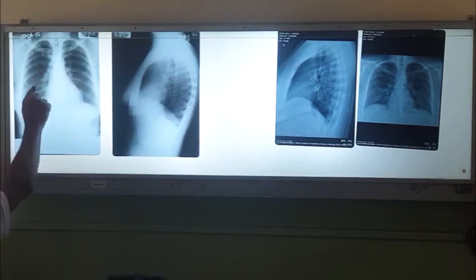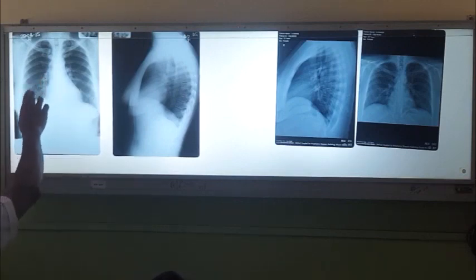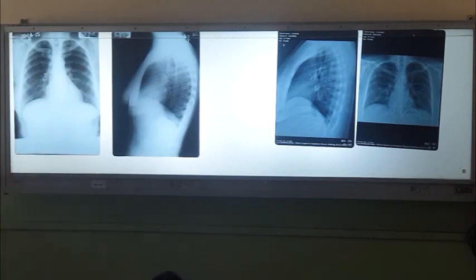And these are all vessels. People talk about bronchovascular markings, but these are vascular markings. Sometimes in bronchiectasis and bronchopneumonia or some other conditions which involve bronchial thickening, you will see the bronchial markings also in bronchiectatic patients. Otherwise, this is what you see here. These are vascular markings. Then look at the size of these vessels compared with the cardiac shadow. If these are dilated, think of pulmonary hypertension.